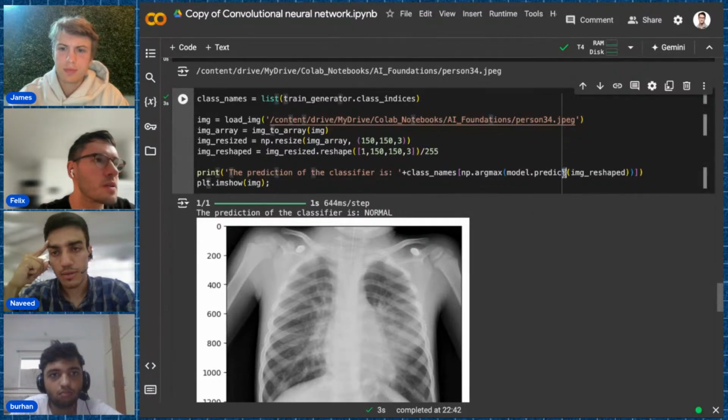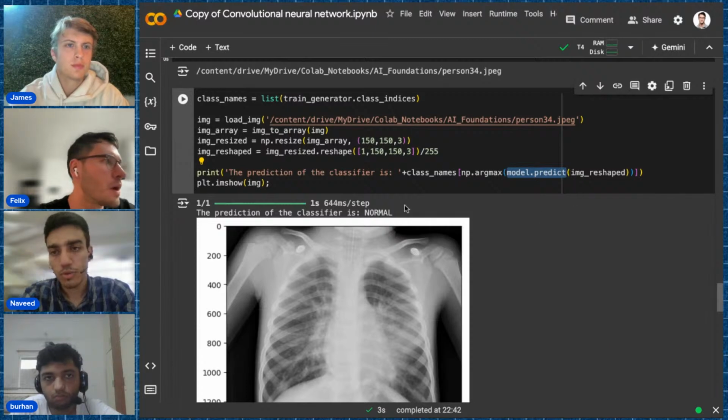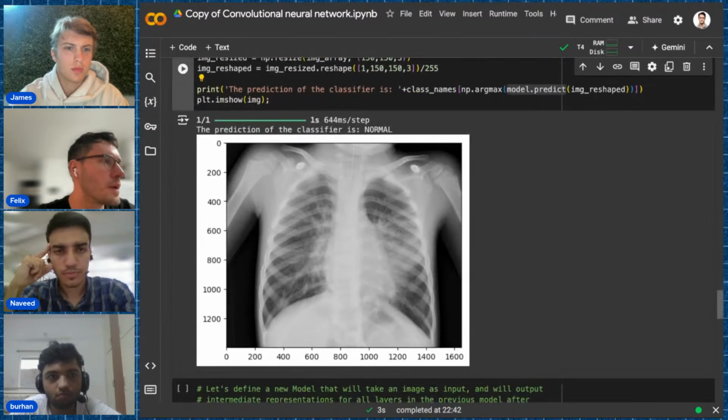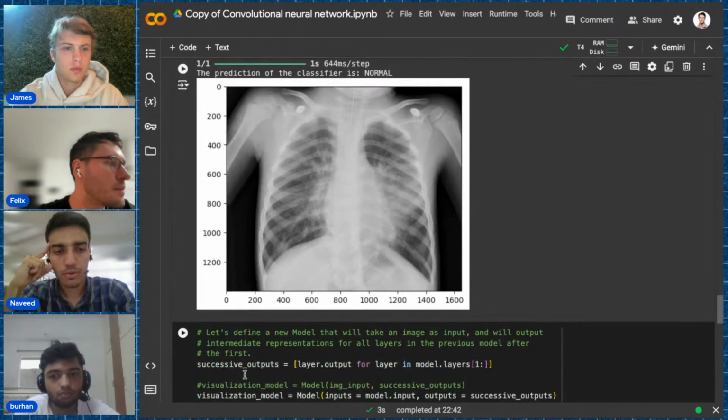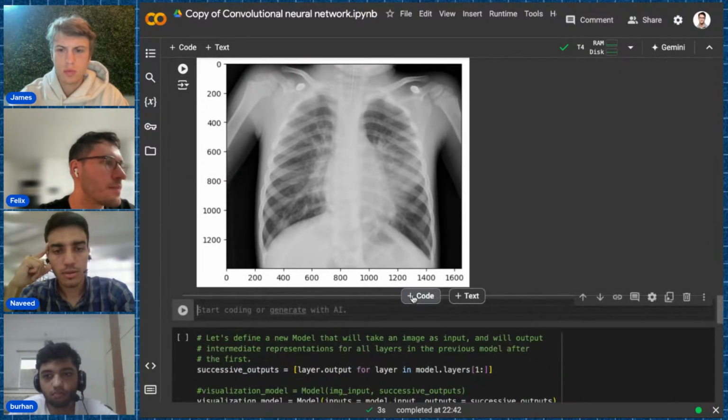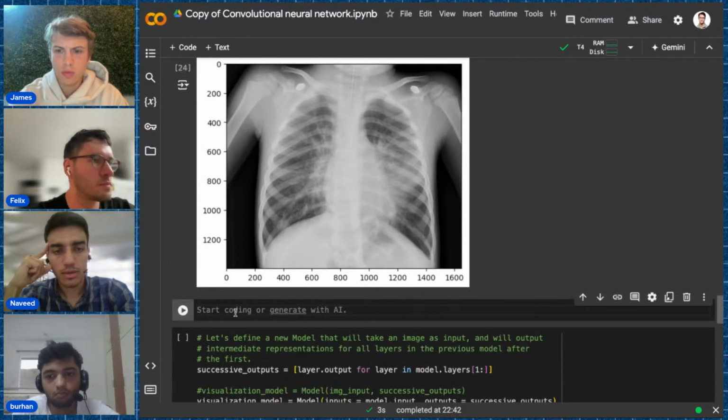You just copy the model.predict and run it in a separate cell, including that image. You have to pass the image. Create a new cell down here. Yep. And now the parentheses and inside it the image we shaped.